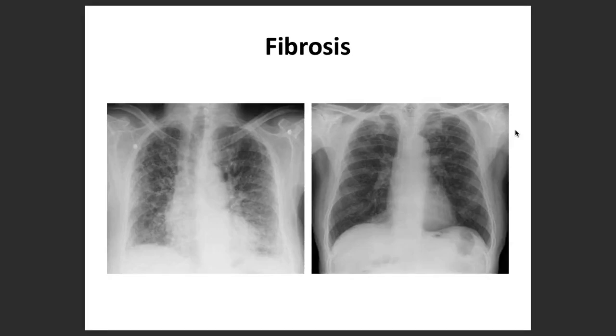There is an effusion in the left costophrenic angle. There is mild effusion also. Wonderful, yes, the terminal bronchioles are fibrous. So for example, for pulmonary fibrosis, what other tests would you like to do? So VQ scan, wonderful. HRCT. HRCT is fine. Yes, HRCT is going to be really something.